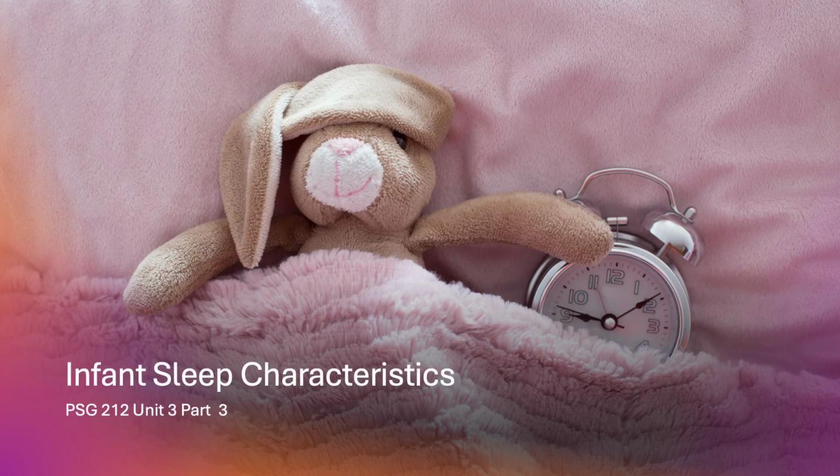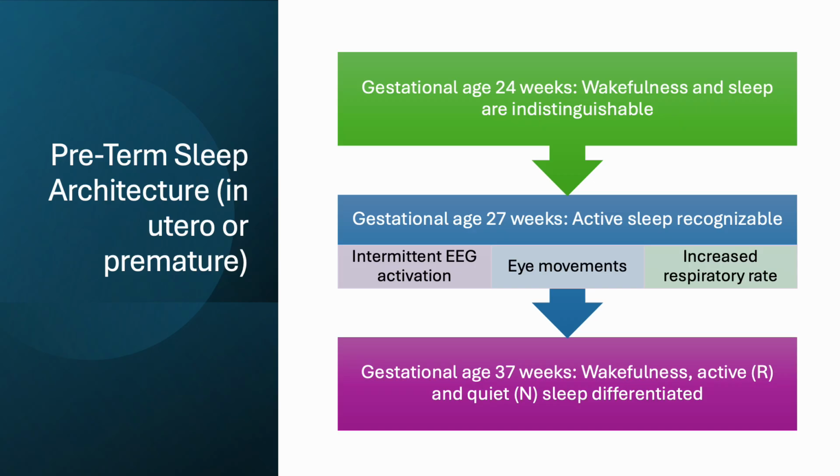So, before we jump right into infant sleep staging, we should talk about the different ages that waveforms show up and what changes as infants grow, because the EEG looks so much different than adults do. So, how does a fetus who is not born yet sleep?